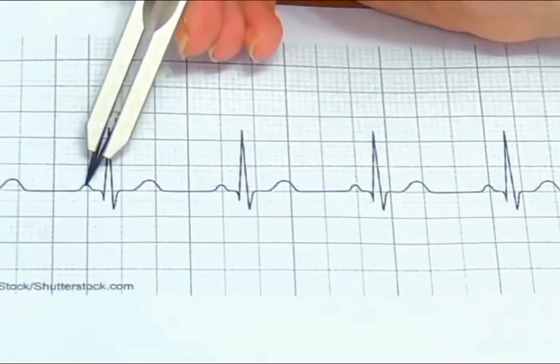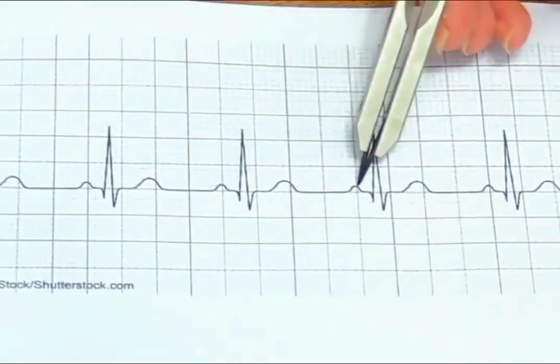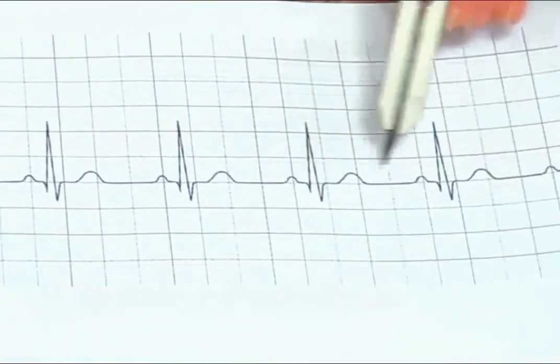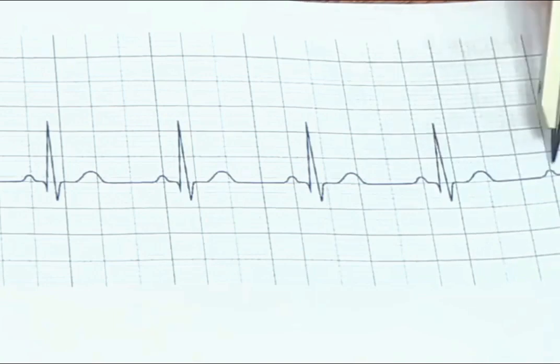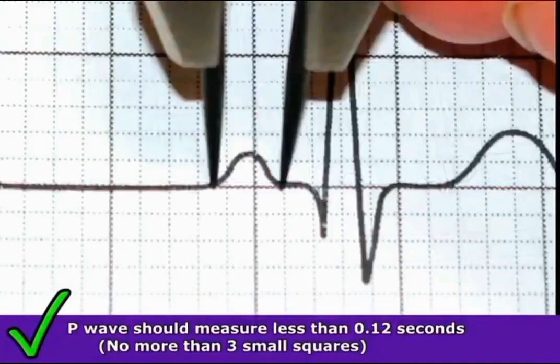So the P wave should always be present in a rhythm if it's normal, and there should be one P wave in front of one QRS complex. And they should be up like this, they should be round, they shouldn't be flat. And their measurement should be less than 0.12 seconds, so no more than 3 squares. So whenever you're looking at the P wave, look at those squares that it's taking up and count them, because remember, each small square represents 0.04 seconds.